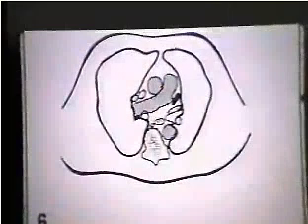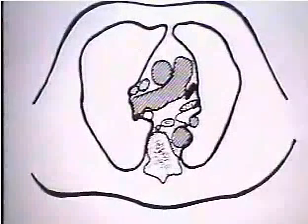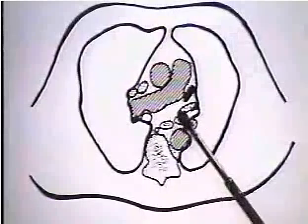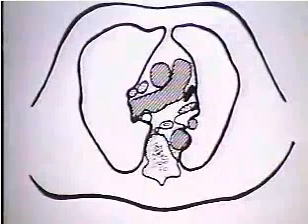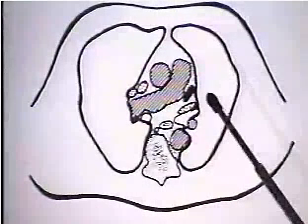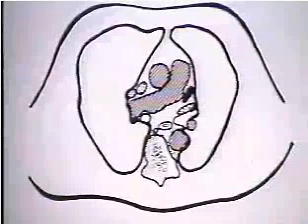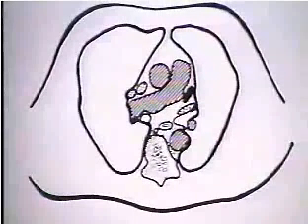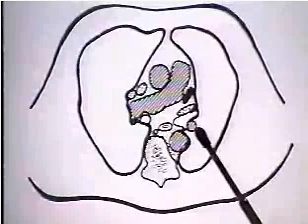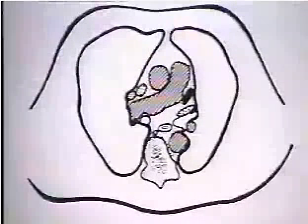If we now look at the CT scan, down at the level of the main portion of the right pulmonary artery, you can see we're completely out of the left pulmonary artery, but there is a vascular structure in front of the bronchus. Now, that's not a bulge of the left pulmonary artery. That's something else entirely, and as we will see in a moment, that is a pulmonary vein from the left upper lobe. There's another little shadow over here that you will see on some, but not all, CT scans at this level, and that is, in fact, the tip of the left atrial appendage. Meanwhile, behind the left bronchus is the left pulmonary artery, usually separated from the descending aorta by a little bit of lung in a normal chest.